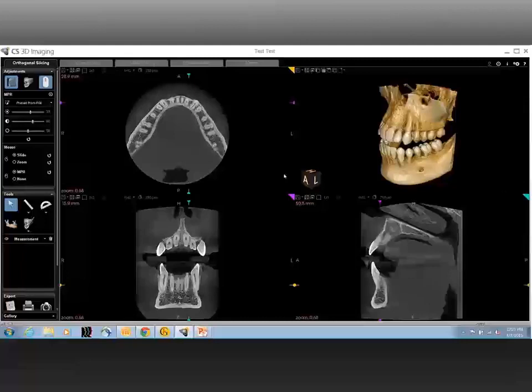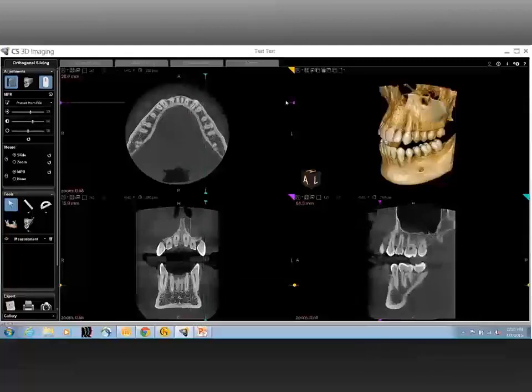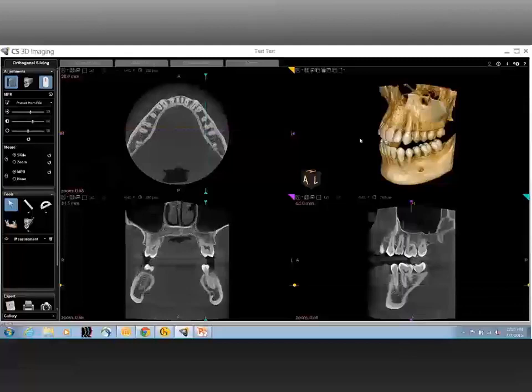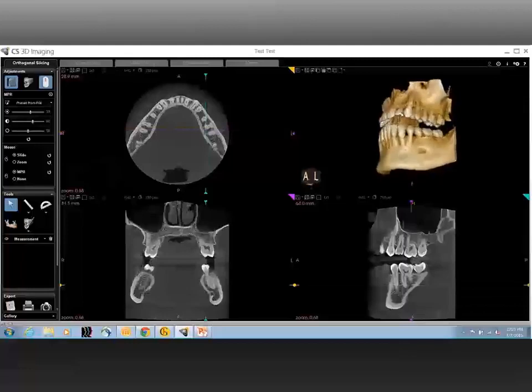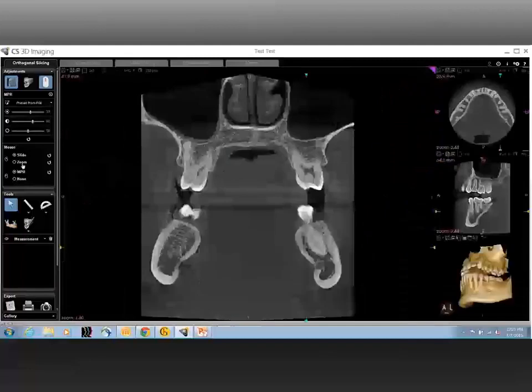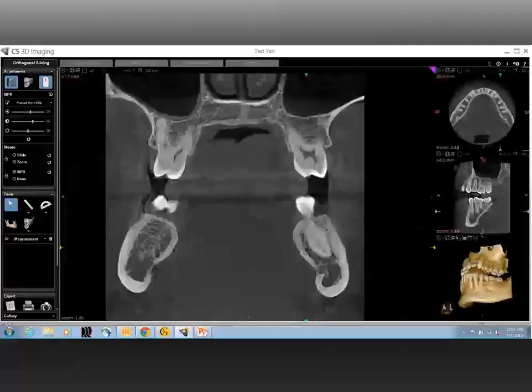Jordan, there are, of course, many important structures, but for the sake of a quick Q&A session, I would limit or list out a few structures that are absolutely important while reviewing a scan. In the mandible, or just as in any bone, a few things to be noted. Number one is the cortical bone. The cortical bone by itself acts as the margin of the mandible. Now, if you notice, as the cursor indicates, the cortical bone is thick. It is pretty prominent and forms the margin of the mandible.